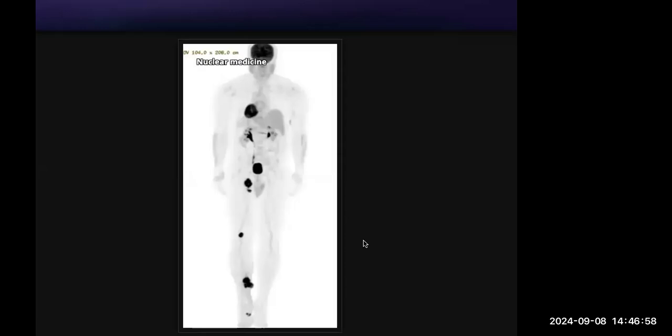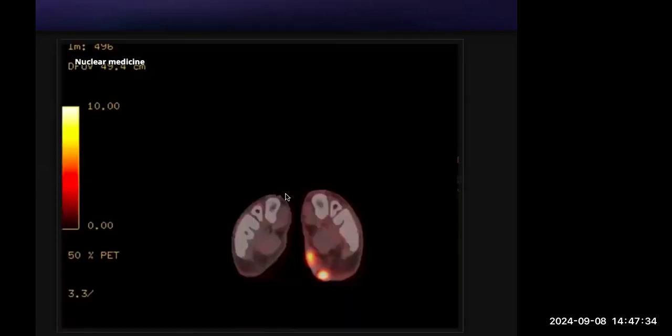Okay. So it is a PET study, showing metabolically active lesions in the mid leg, distal foot, and in the area mentioned before, which is the sole of the foot. You can ask for control and scroll through these images if you want.